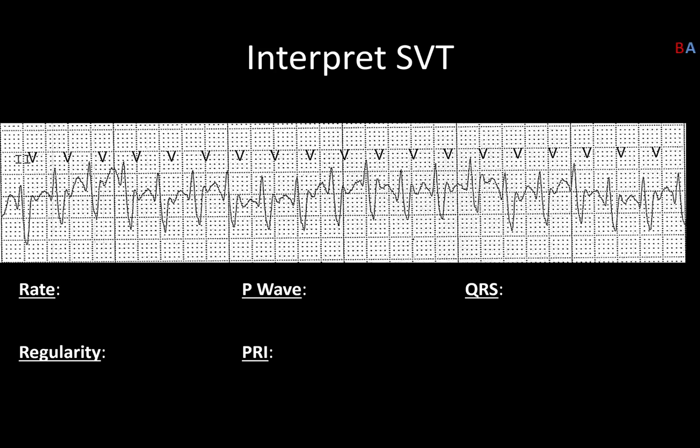All right, looks pretty ugly, doesn't it? I will just go ahead and open up with this and say, check the patient. Now, actually, in reality, this is a patient I was taking care of. I was actually standing at the bedside when this rhythm occurred, so I knew what was going on, but if I wasn't at the bedside, sure as heck this would get my attention, and I'd go scurrying in there to try and figure out what's going on.